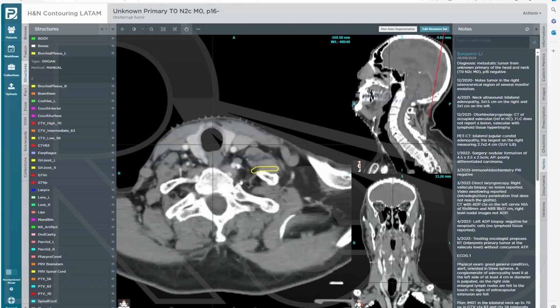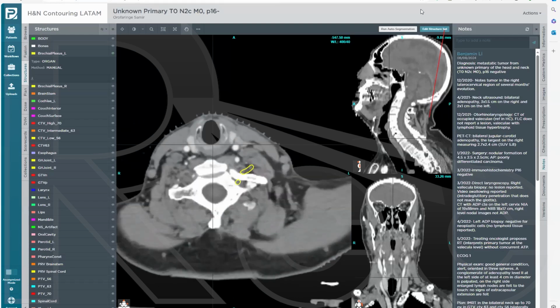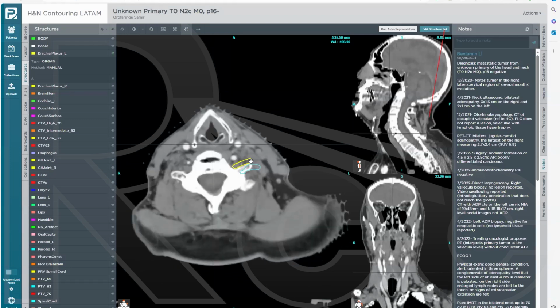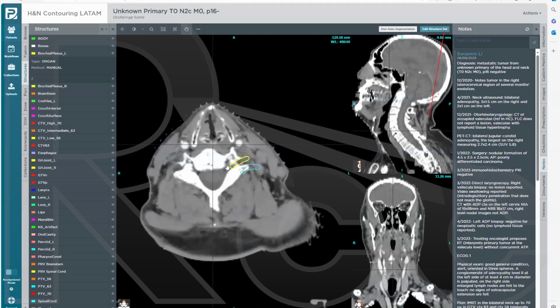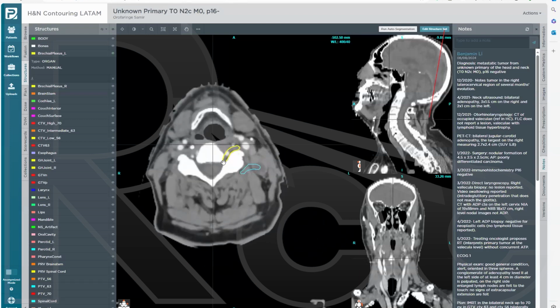Now, do you see this right here? That's like the T1 coming down right here into here. And then what I do is I draw that same space right here between the scalenus muscle and here, just like here. And we keep going up. Right, we have T1. Then you have the C8. You see the C8 nerve root here. And you go up. These go back up. And you have the C7, C6, and C5.